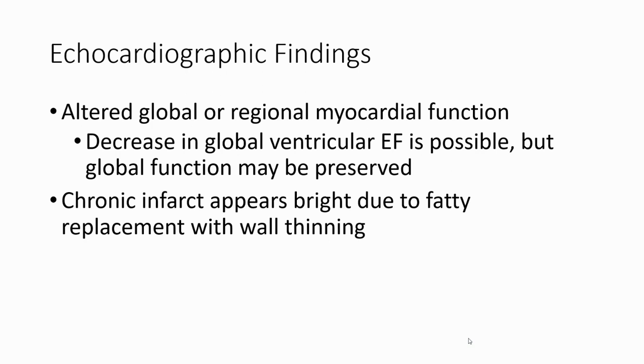Echocardiographic findings: there is either global or regional myocardial dysfunction. A decrease in global ventricular ejection fraction is possible, but global function may be preserved. Chronic infarcts appear bright due to fatty replacement with wall thinning.